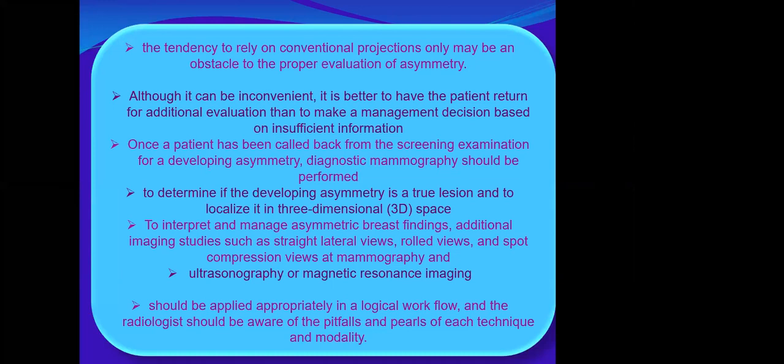If it seems to be more or less real, we have to proceed and evaluate it further. However, we are saying developing because it is a more concerning asymmetry, concerning lesion. To interpret and manage asymmetric breast findings, we need to use additional mammographic views like compression views and straight lateral and other mammographic views.